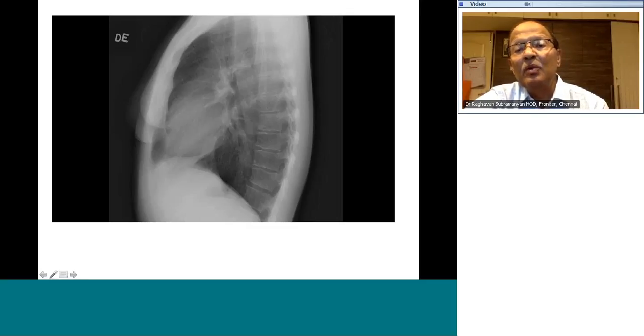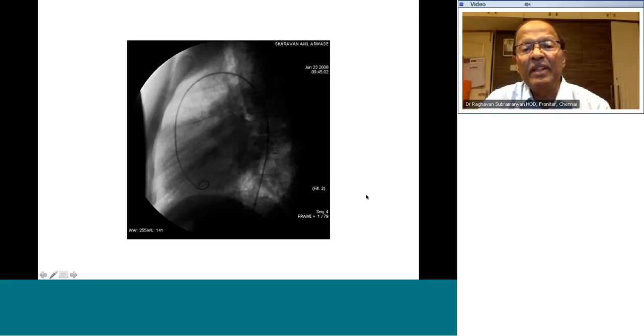You don't see the two sets of ribs separately. You see the side view of the sternum perfectly, and a transverse section from the side. And you can see that the vertebral bodies all form beautiful rectangles stacked on top of each other. This tells you that the chest X-ray is a lateral view. Now it's easy when you have the whole thorax. How do you identify a lateral view in an angiogram when you collimate it to a very small area?